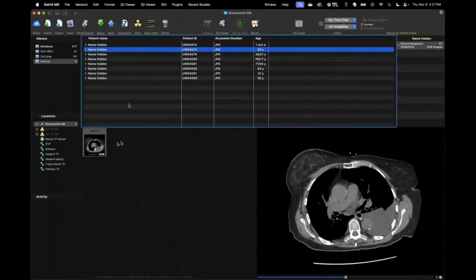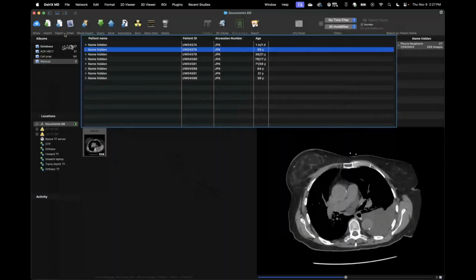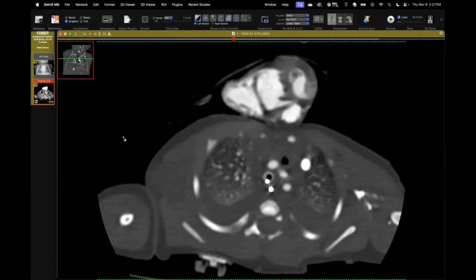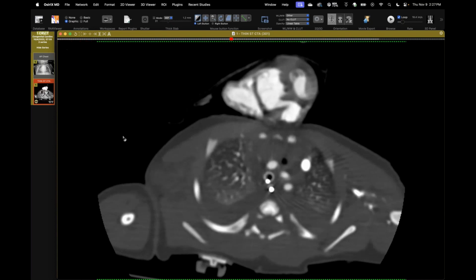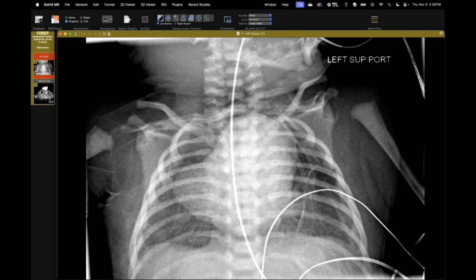All right. This was an interesting one. So Jeff, yeah. Can I just throw in something? This is tangential. Of course. So I get upset with the residents who will say that the nasogastric tube tip projects over the stomach, you know, just really sort of pussyfooting around the notion that we don't know for sure that it's inside the patient. So I counter that by saying if you're going to be fair, you should say that the heart projects over the chest, because we're not sure it's actually in the chest. And now you presented me with an example that just destroys my argument here, so I'm really resentful. Yeah, I'm sorry, David. Yeah, the heart does project over the chest in this case.